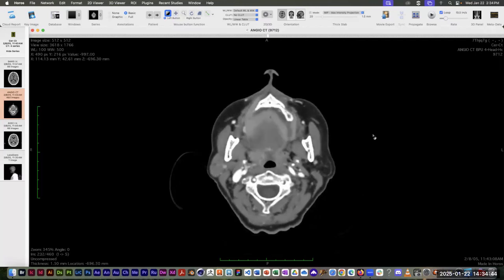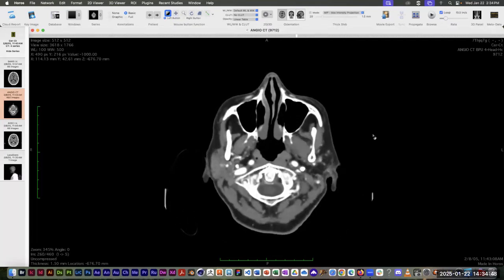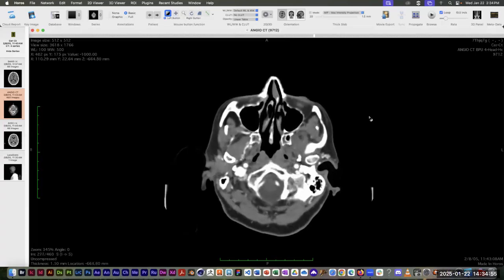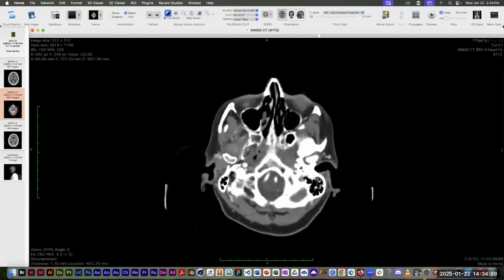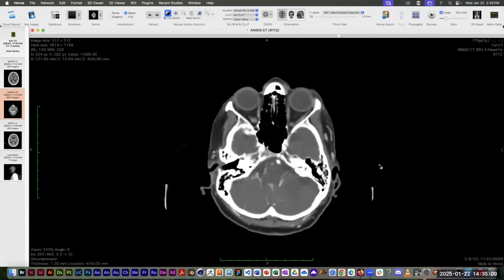And then there's his nose, nasal cavities coming into view. Nasal concha up here in the nasal cavity. Now we're getting up into the skull. This dark space down here near the ear, that's the mastoid process. It's filled with little air cells, little sinuses. Oh, you can see his eyes now. We're up in the orbits.